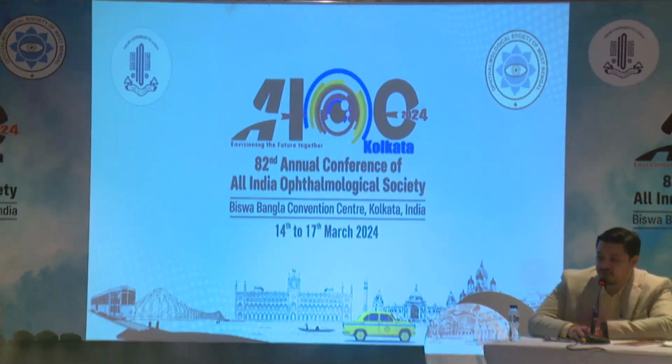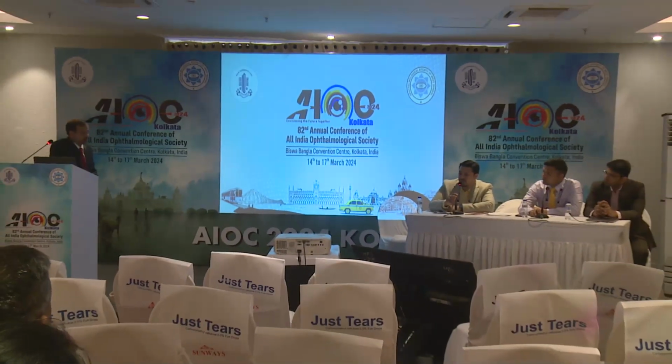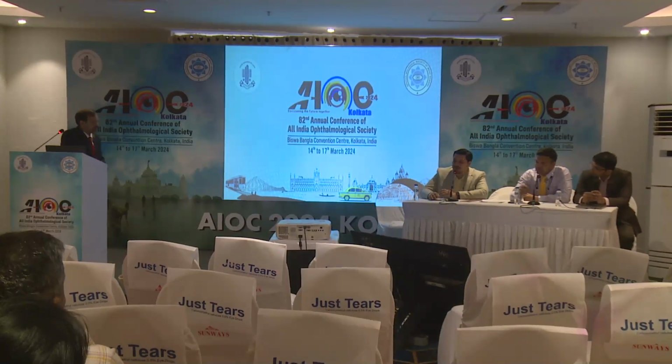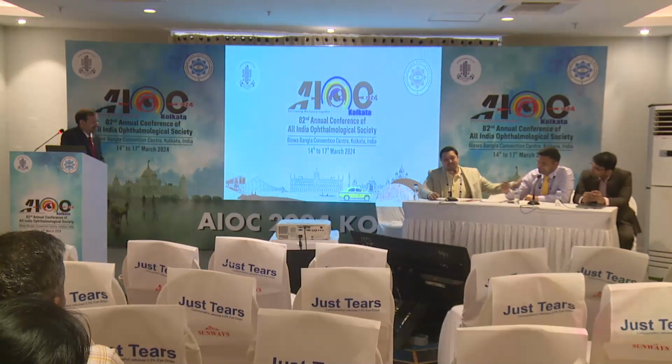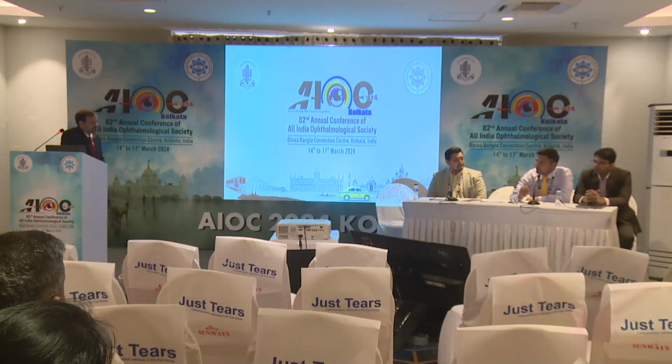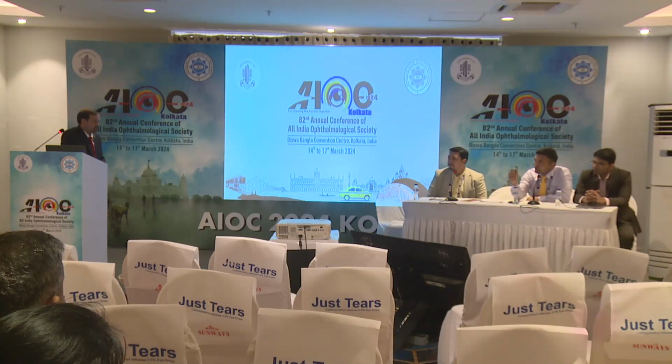Thank you, sirs, for giving us such a comprehensive review of OCTA in diabetic retinopathy. Please, sir, if you allow, one question that I would like to ask you based on your study. We have all observed that when we do OCT angiography in diabetic retinopathy in the central 3 mm area, you see these beautifully capillary non-perfused areas in the posterior pole. Do you offer any treatment based on this? Do you laser those areas?